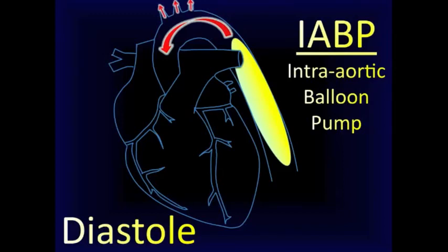Hey, welcome everyone. This video will introduce us to the intra-aortic balloon pump as well as the aortic pressure curve that is associated with it. Now, while several forms of mechanical hemodynamic support exist, the balloon pump has easily become the most popular, and we'll go over the really important concepts to know about the pumps. And likewise, knowing the aortic pressure curve associated with these devices can have vast implications, which many of you who work in the cardiac ICU setting already know.